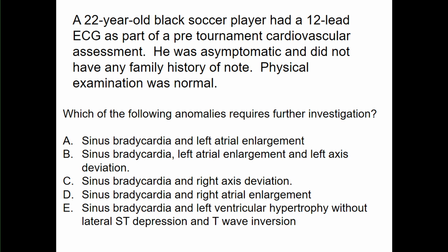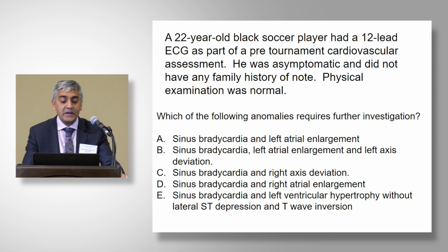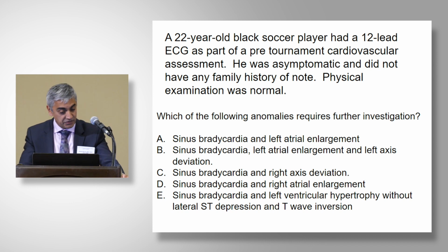A 22-year-old black soccer player had a 12-lead ECG as part of a pre-tournament cardiovascular assessment. He was asymptomatic and did not have any family history of note. His physical examination was normal. Which of the following anomalies requires further investigation?